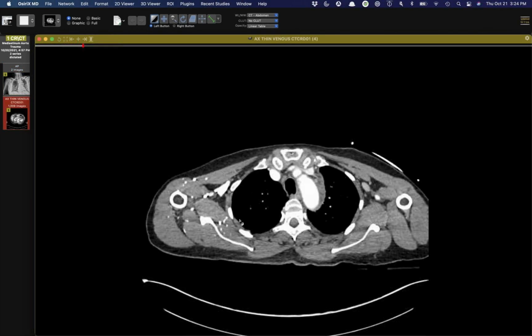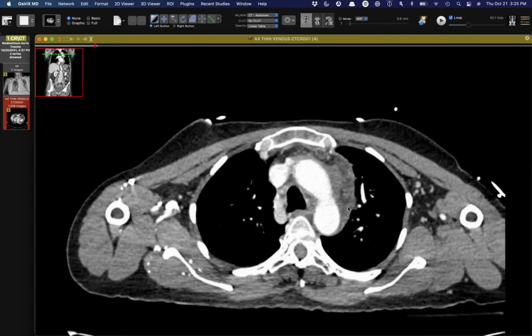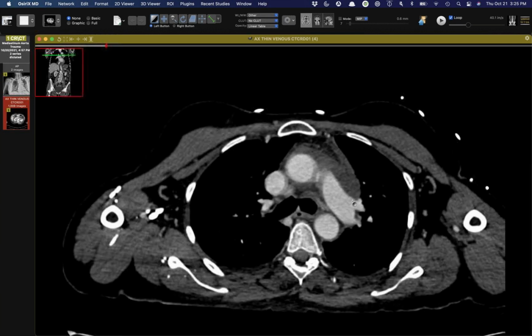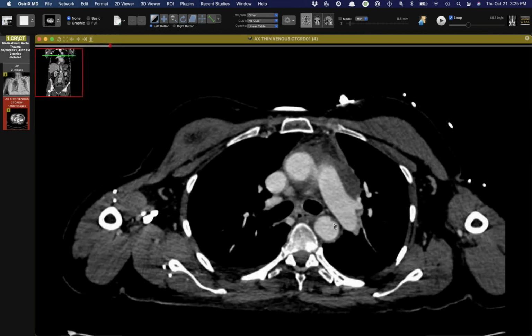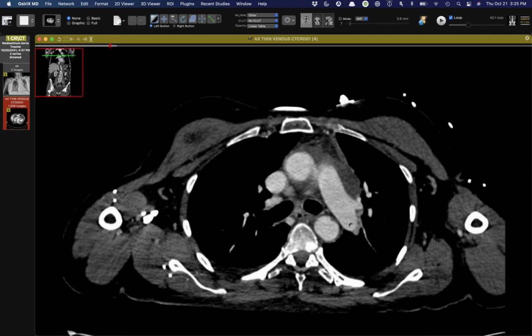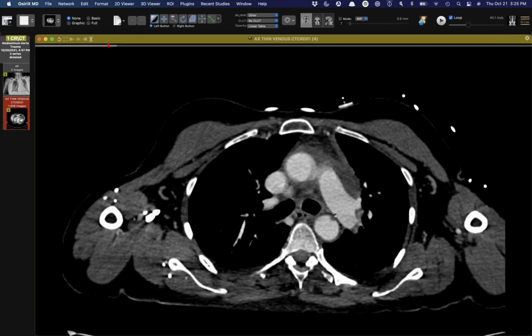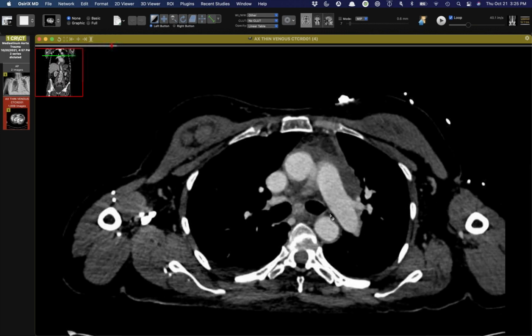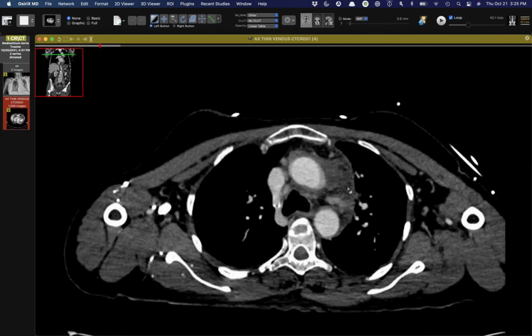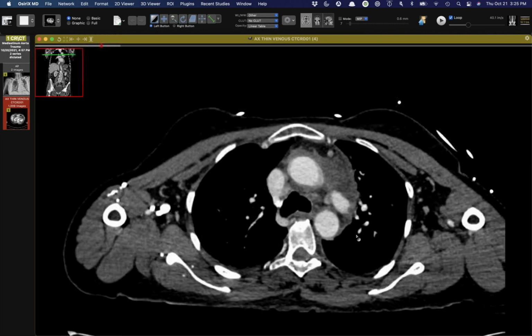And sure enough, you can see there's mediastinal hemorrhage surrounding the aortic arch. And when you look, you'll see in the proximal descending aorta, there's a subtle intimal defect here. So I think this fits with a minimal aortic injury, or just one of these grade 1 injuries just involving the intima or intimomedial wall, since there's no external deformity. And there's all of this hematoma here. There's no sternal fracture to account for that, and you've lost the fat plane around the aorta.